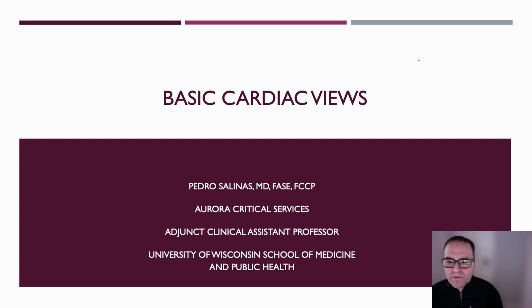In these recorded mini lectures, I will review the ultrasound transducer movements needed to obtain the basic cardiac windows and views. The slides are a mix of ASC education material and HeartWorks video that I made.